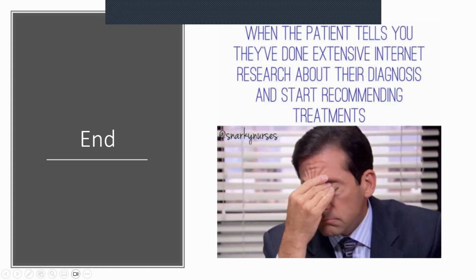And unfortunately, our patients do this. Now, hopefully in the next coming weeks, we're going to have a look at some other left bundle branch blocks. I want to discuss left bundle branch blocks in a bit more detail, so that you understand a bit more of what's going on behind them.